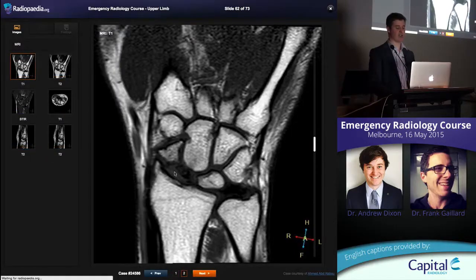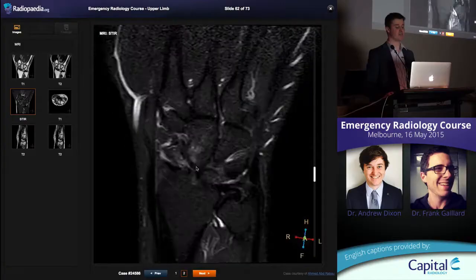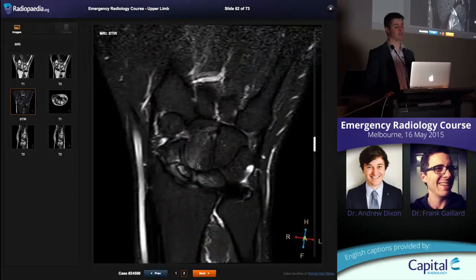Here's a patient who had an unrecognised scaphoid fracture and it was significantly displaced, and they've developed avascular necrosis of the proximal pole of the scaphoid. See that little dark area? This is the normal fatty marrow signal within all the other bones. On the T1 weighted MRI, proximal pole has become dark. On the fat-saturated fluid-sensitive sequence, you can see there's edema in that proximal pole. Starting to get degeneration of the joints around there, the cartilage is being lost, and you're getting edema in some of the other carpal bones as well. All right, so that's why scaphoid fractures are important.